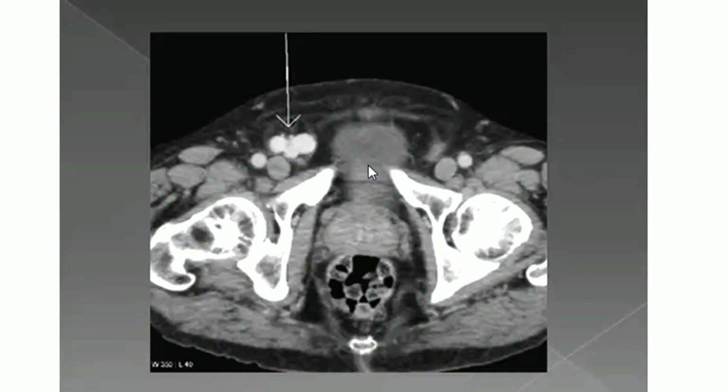So I would like to see the scrotal sac to see if there are any varicoceles present to confirm the diagnosis, or in case of any pathology like carcinoma, which can lead to the compression. And I would also like to see the upper abdominal images. What's your recommendation?